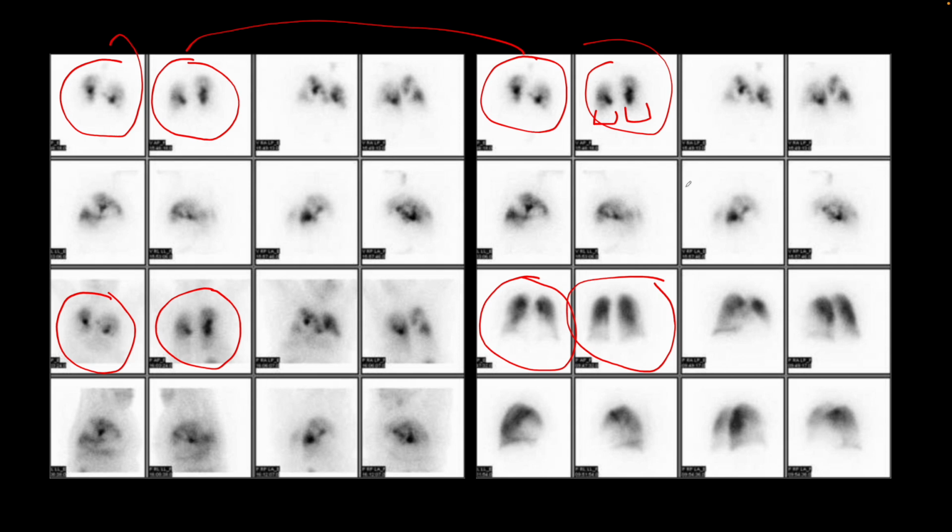What happened here was that the first time they wanted to do perfusion, the dose got infiltrated and they weren't paying attention to the count rate on the perfusion studies. And what we see on the images labeled perfusion is just ventilatory activity, right? So when these two images look very similar, you have to doubt whether the scan has been performed correctly, whether the radiopharmaceutical has been injected correctly, right?